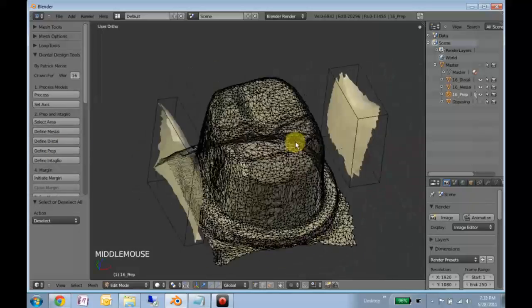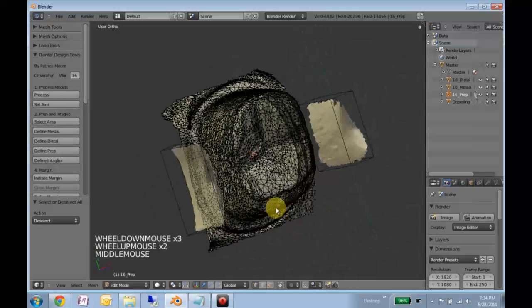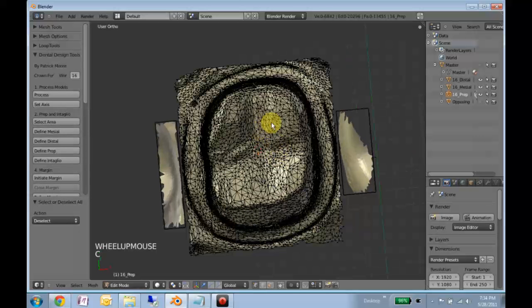It gives you this nice compact view here. And now you'll notice things should get a lot more fluid and a lot faster. If your computer, I'm running this on a mid-range laptop and it does just fine. But if you were taxing your computer resources, after this step, things should speed up significantly. So let's circle select.